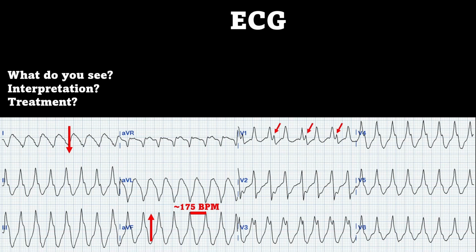I prefer to use a cutoff about 120-130 beats per minute when trying to discern between ventricular tachycardia and something called accelerated idioventricular rhythm, or AIVR. The reason why is that AIVR is thought to be a reperfusion rhythm and is usually self-terminating, so no need to blunt the rhythm with treatments. Ventricular tachycardia, on the other hand, is deadly and you need to correct the rhythm.